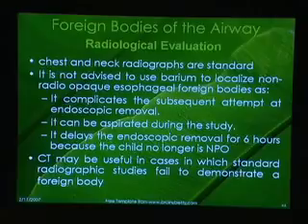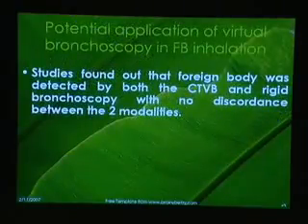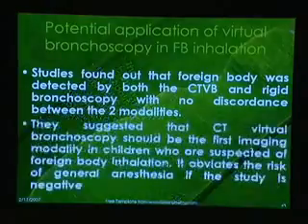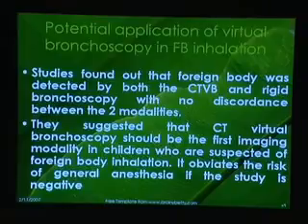CT may be useful to assess when standard radiographic studies fail to demonstrate the foreign body. Studies found that the foreign body was detected by both CT virtual bronchoscopy and rigid bronchoscopy with no discordance between the two modalities, so they suggested that CT virtual bronchoscopy should be the first imaging modality in children suspected of foreign body inhalation, to obviate the risk of general anesthesia if the study is negative. Here we have a foreign body, and this is the corresponding virtual endoscopy showing this tricky artifact indicating the location of the foreign body.